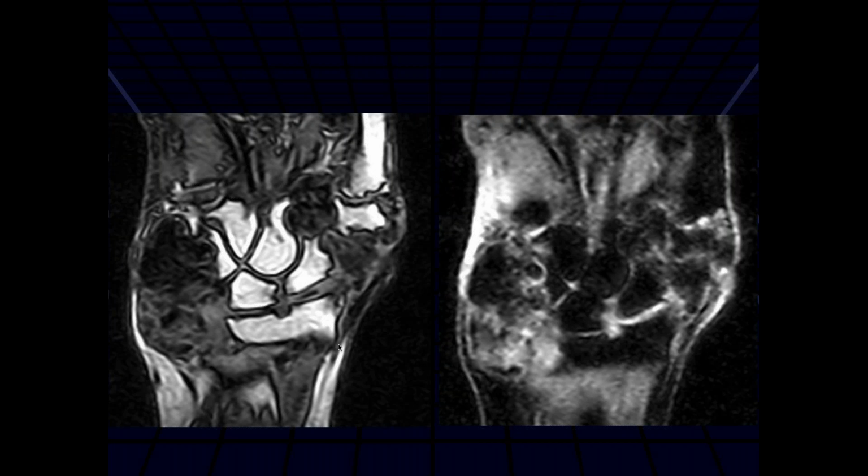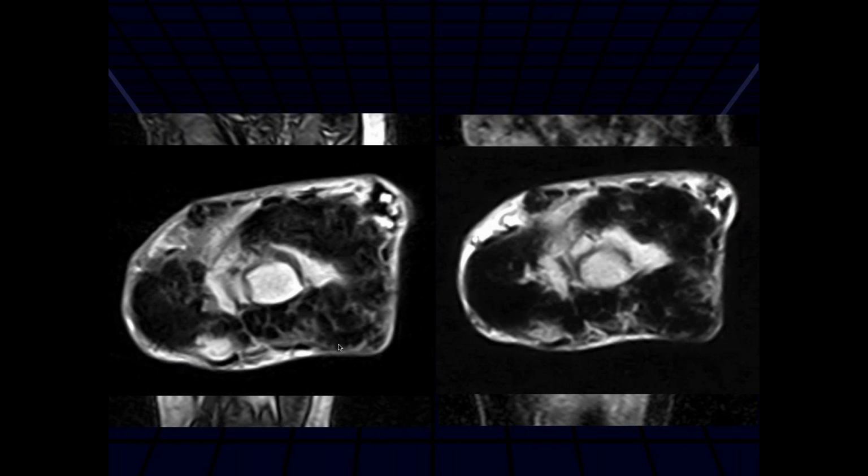And only a few joints are almost normal, not quite. Yeah, but what we're looking at here is a series of masses that are low in signal intensity. So that's the differential that we're looking at right now. Okay, so these must be calcified masses within the joint spaces predominantly. And then they're better seen on the axial follow-up series you were showing. Yeah, you can see those little rice bodies, almost looks like a rice body.